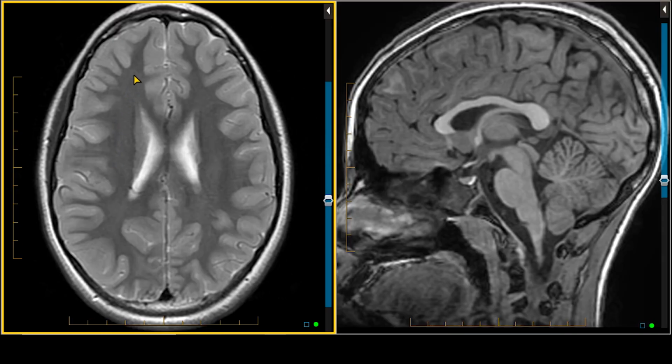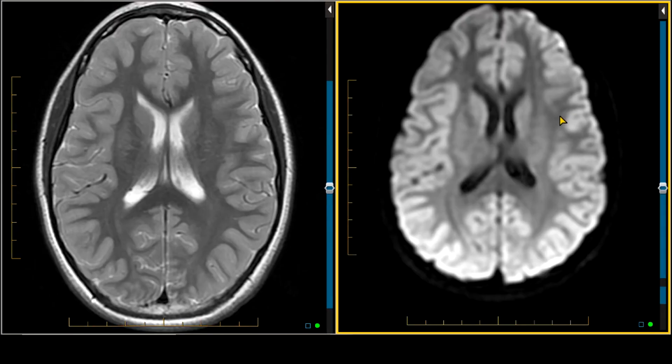By 9.5 years old, the only white matter which is unmyelinated is very subtle peripheral juxtacortical connections in the frontal lobes, which is typically below the ability to detect on MR imaging. So everything looks fairly normal. It's important when looking at MRI to look at all imaging sequences, one of which is the diffusion-weighted image. And people are used to using diffusion-weighted imaging to look for strokes.